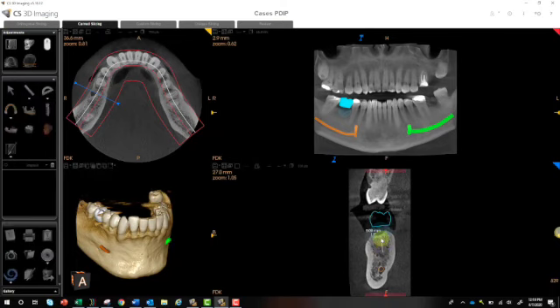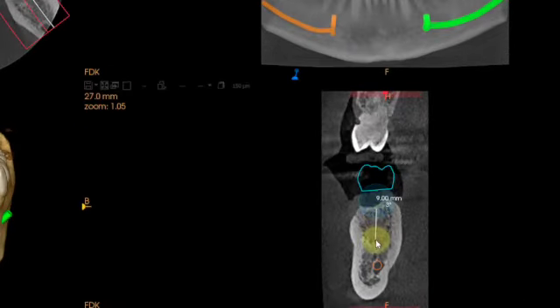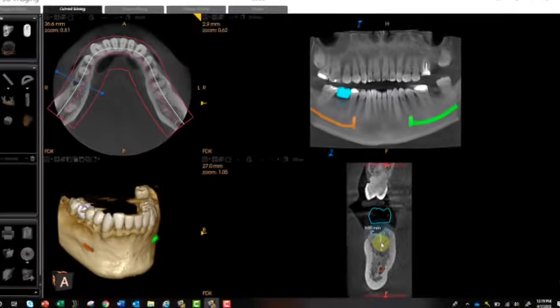You do one single click, and you'll notice that 8 millimeters is actually the shortest distance it's allowing me to measure. And that's because in the implant system and grouping that I have selected as my favorites in the software, that's the shortest implant. So that's why it's not allowing me to go any shorter than 8 millimeters. You'll also notice after I do my first click, it shows the degrees of angle I have compared to where I have my crown placed.